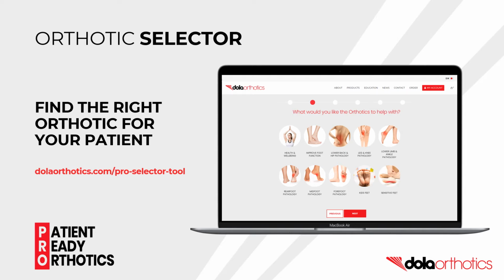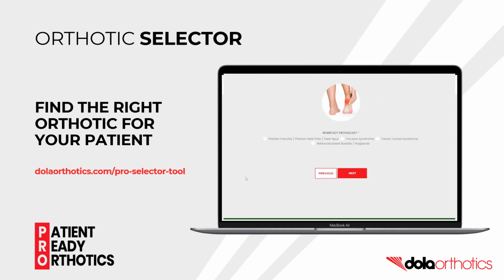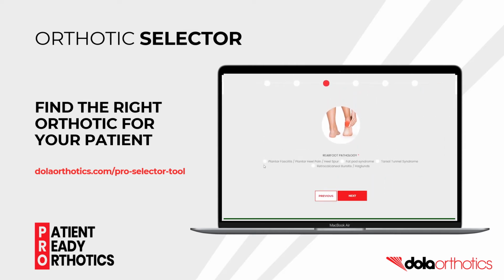If they have a pathology, from here you can select the general region, including forefoot, midfoot, rear foot, lower limb and ankle, leg and knee, or hip and lower back, and then select the specific diagnosis. This example shows the selection of rear foot pathology, and then the selection of plantar fasciitis, plantar heel pain, or heel spur from the pathology list.